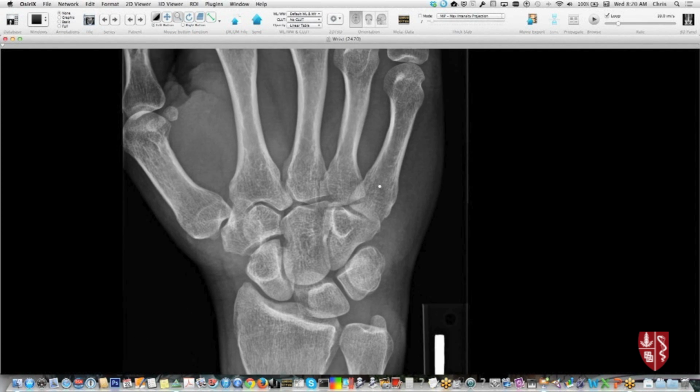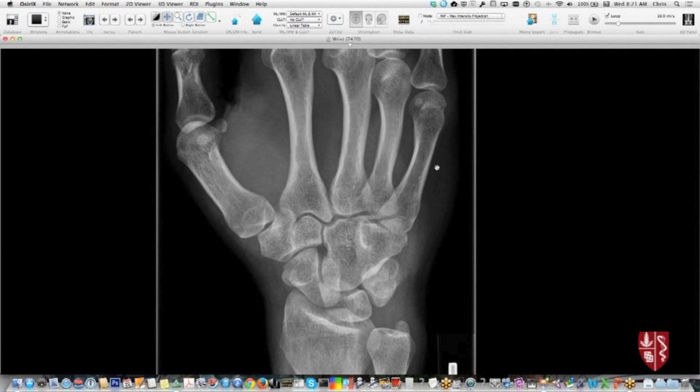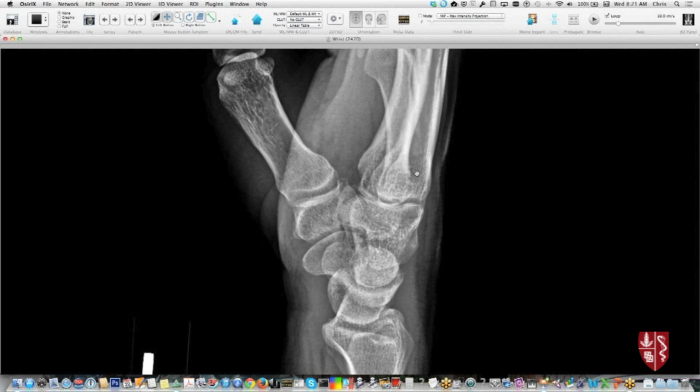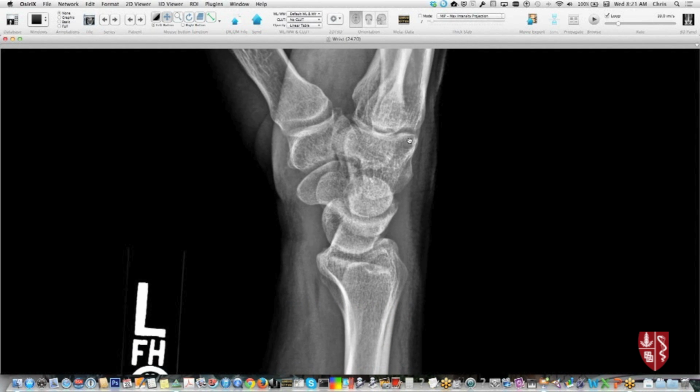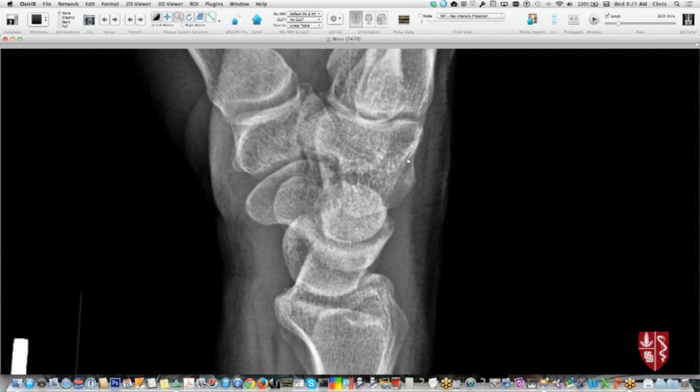So take a look at this one, different patient, and check out the carpal alignment. This is kind of like that example in the slides. Proximal arc, pretty good. The second arc, not quite right? And it could be because the lunate's kind of projecting out like this. It's difficult to tell about the scapholunate interval because of the projection, but it's a little suspicious that it's malaligned here. So there's the oblique view, and then here's the true lateral view. And hopefully after seeing a few of these, you can say, aha, that's definitely not a normal alignment pattern.